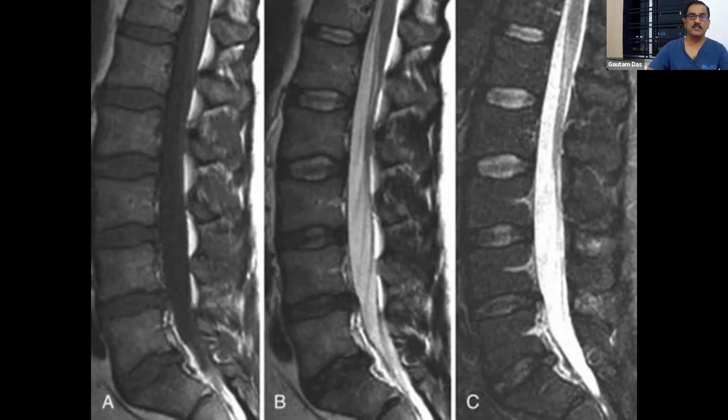So how much hydration is there? Another thing you have to remember is that in the whole day, if you are doing an MRI early in the morning, the disc will be looking whitish. If you are doing the MRI in the evening, the disc will be less white, because when you are lying down, how much water will be there depends on two factors: interdiscal pressure versus the hydrostatic, osmotic pressure. Osmotic pressure will be trying to absorb the water.